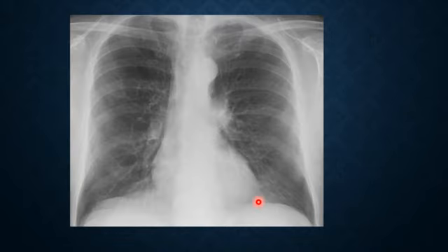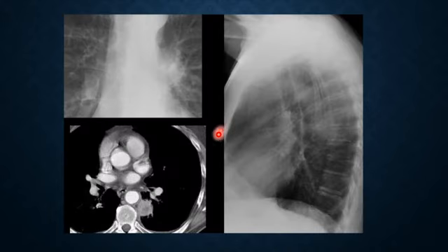What about this one? Outside or within? Do you see the vessels? Yes, there are vessels here. You can see them here and here, branching. Yeah, it's obvious. These are vessels within the hilum, so this mass is outside the hilum. When we did a CT scan, we saw this mass here in the left para-aortic, paravertebral region, and it was somewhere here on the lateral chest X-ray.